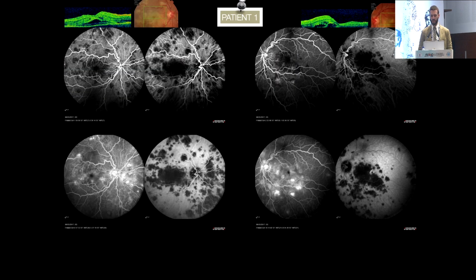Now, the first patient, you can see straight away in the fundus has some placoid lesion. So at this point, if OCT is not giving you the correct diagnosis, you go for dye testing. In the dye test, you see something that blocks early in FA and stains late. So this is quite typical of AMPPE, and the ICG is showing us the choroidal and choriocapillaris non-perfusion.